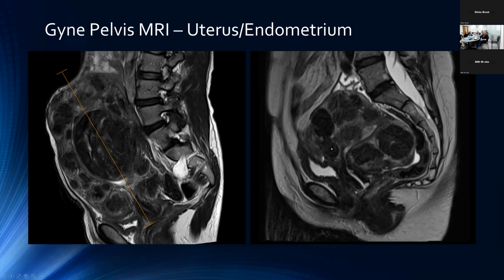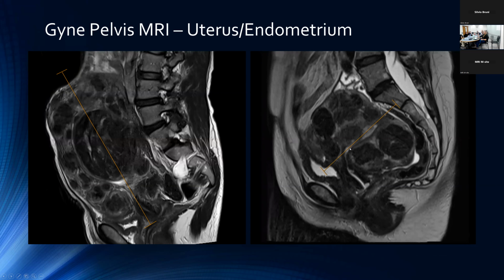On the right, here again, multifibroid uterus, but you'll notice that the uterus is anteverted but retroflexed, with the bulk of the uterus oriented dorsally, and that endometrial canal also kind of angled dorsally. So in this case, given that you can see this endometrium quite well, your line would be drawn approximating the long axis of that endometrium, and directed dorsally.